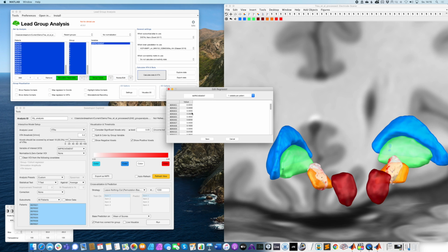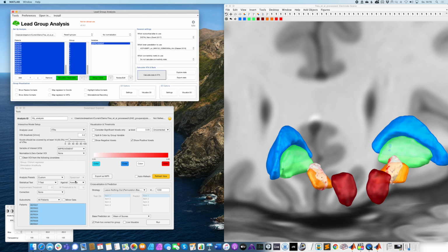And then you see that most of them get better. There are just a few with a negative sign. So the average value will be something positive. And then you're testing with the t-test against the average improvement. So that is, in this case, already better than testing against 0. Alternatively, you could also test against a custom threshold.